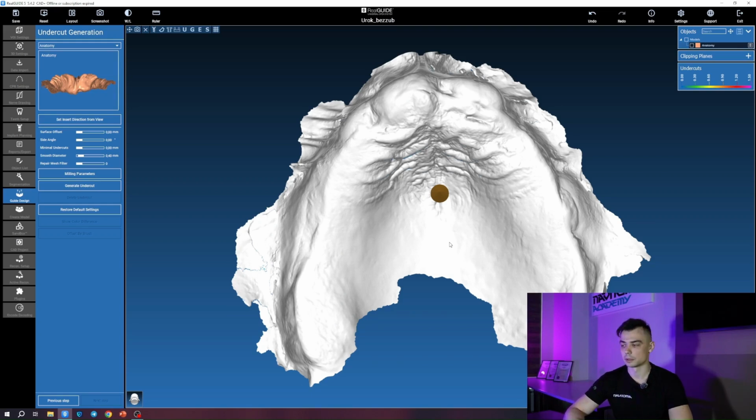It means that if for some reason during the CT scan the radiopaque template does not fit in the oral cavity or fits incorrectly, well, on the one hand, that's quite bad because you'll have to redo everything, but on the other hand, the glass is half full, and that's actually very good because it's better for the template not to fit at the CT stage than for you to have already placed the implants and then realize that they ended up crooked.